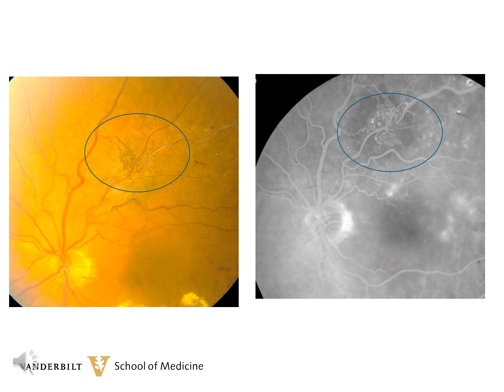This patient has both diabetic retinopathy and a prior vein occlusion in the left eye. You can see some old laser marks inferiorly on the color photograph, as well as some dot and blot hemorrhages in the temporal macula. But the main thing to pay attention to is the sheathed vein inside the blue circle and the dilated blood vessels.